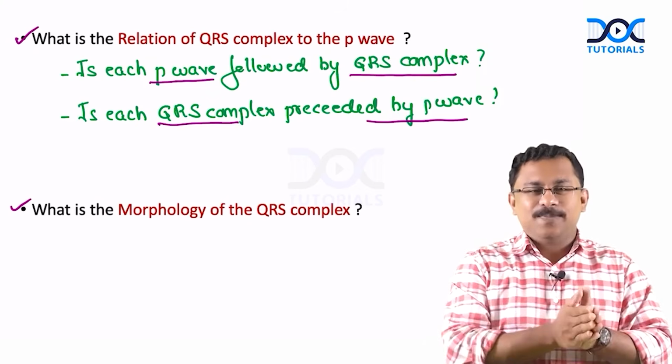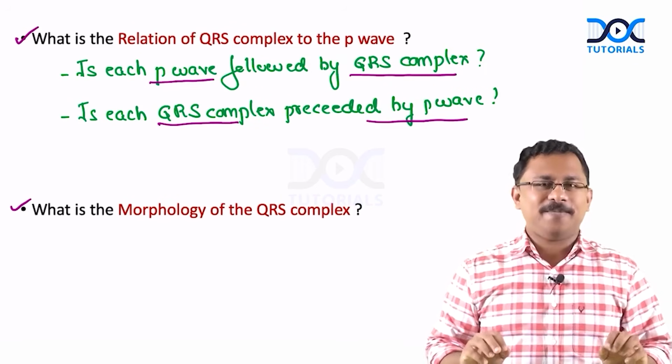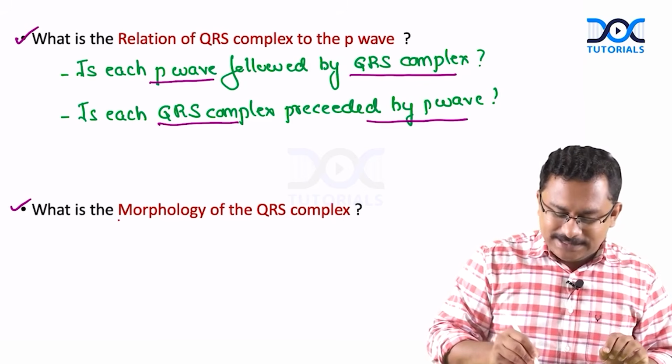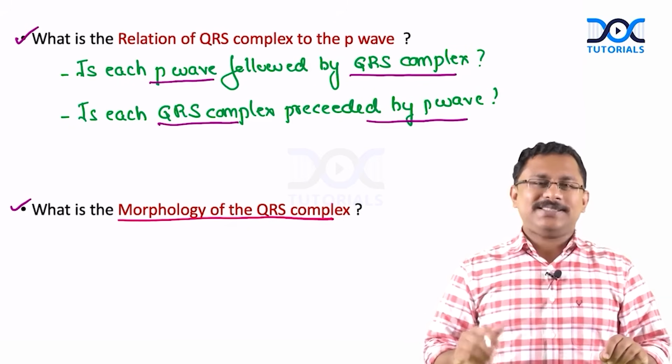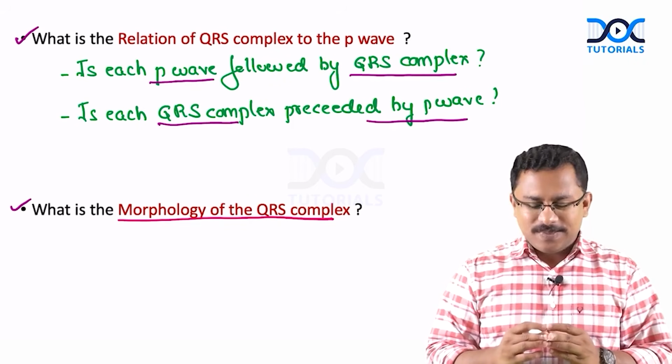Okay, is each P followed by QRS? Is each QRS preceded by the P wave? Now let's move on to the next question, that is regarding the morphology of the QRS complex. Okay, morphology of the QRS complex.